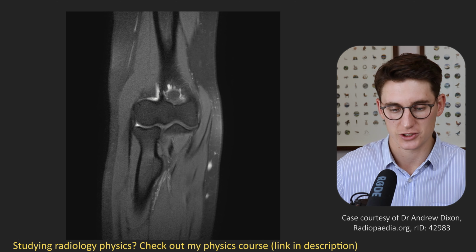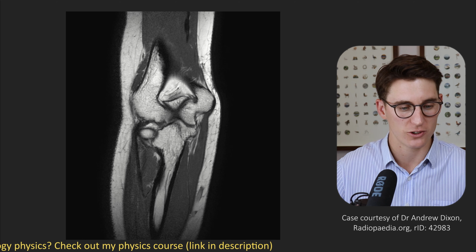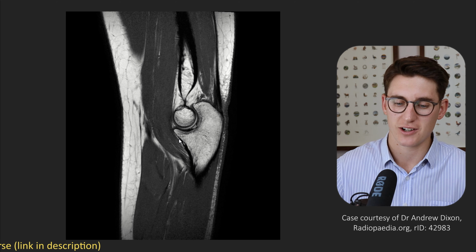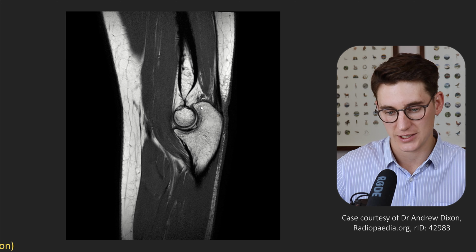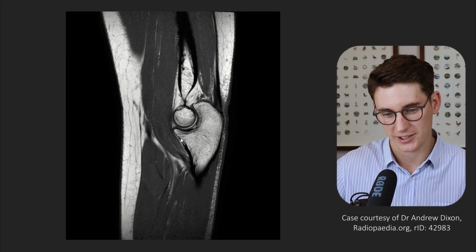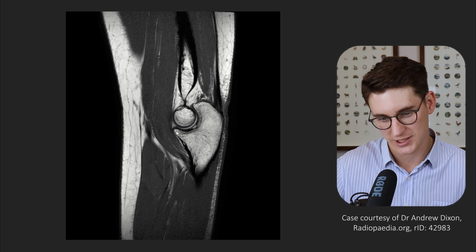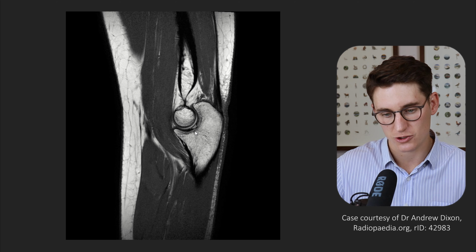looking for various fractures. I just want to touch on 2 things before we end off that people commonly get confused with. The one is we can see our ulnar bone here on the sagittal PD, our olecranon coming posteriorly and this coronoid process coming anteriorly. You see the articular surface here of our trochlear notch. Then there's a disruption here, and then we get a continuation of that cartilage there. This is normal. This is what's known as our trochlear ridge.